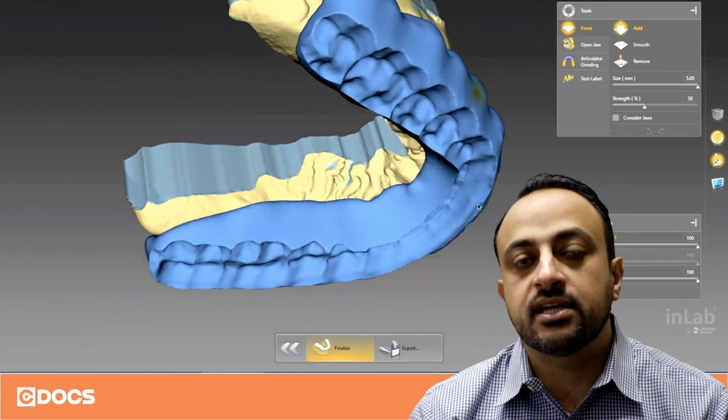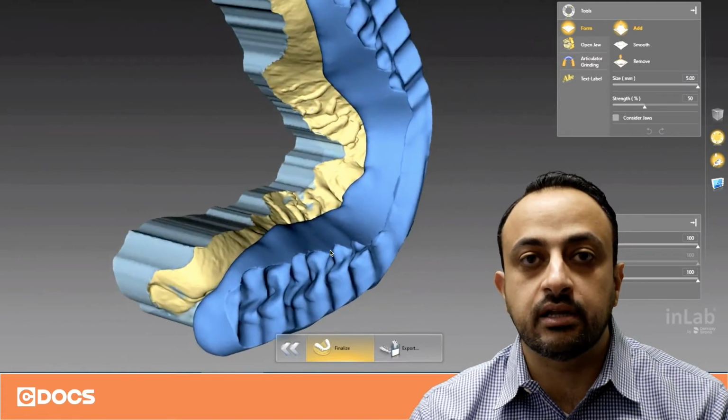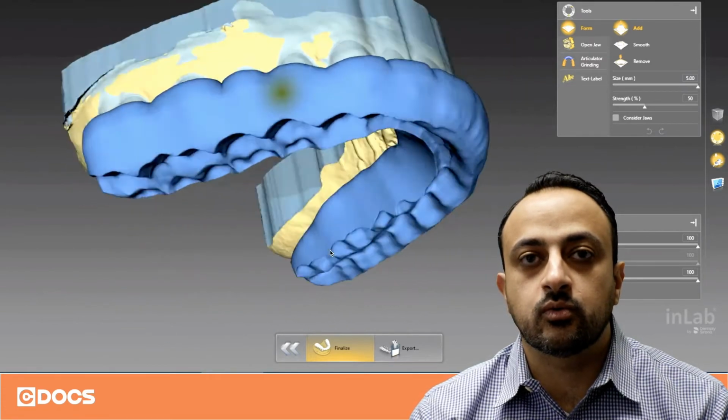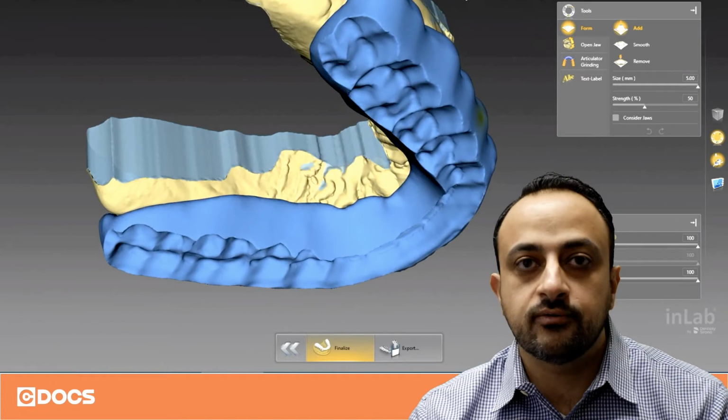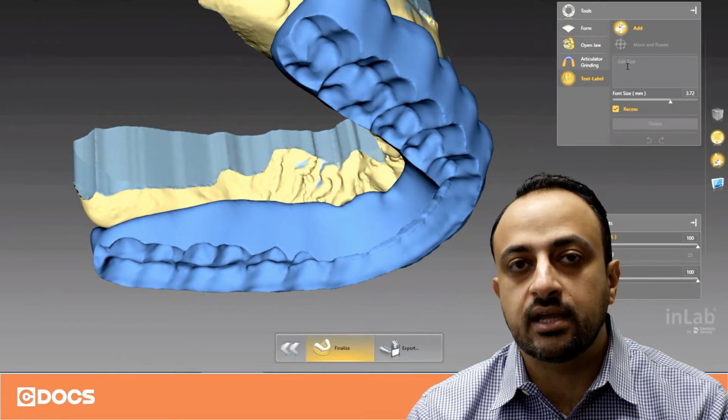Now, what can sometimes happen is over time, as you develop a busier practice or busier splint manufacturing process, you will run into potential confusion, not knowing whose splint is whose, and there's definitely a neat way to organize it.